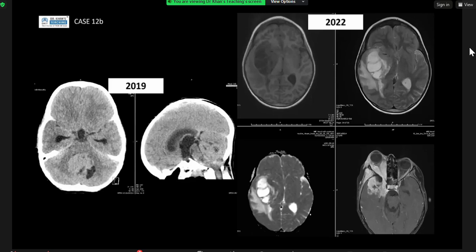Yes, you can think of other things like hemangioblastoma, but often, this is a non-contrast scan. You're thinking there'll be contrast enhancement with a bigger cystic component. The other thing you think of is a pilocytic astrocytoma. Again, much larger cystic component. The others do have metastases down the CSF, so like neuromets, but it's just an interesting case, so take note of the timeline. If you hadn't gotten that this was some sort of brain tumor, because I think it looks fairly aggressive, right?